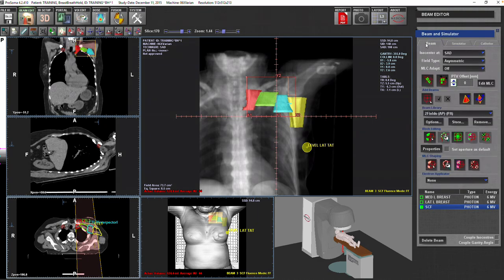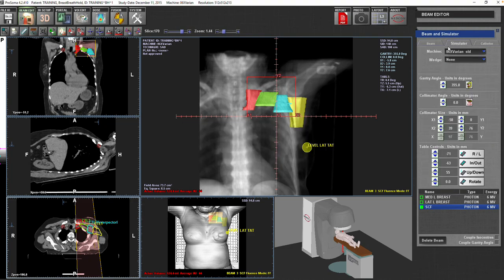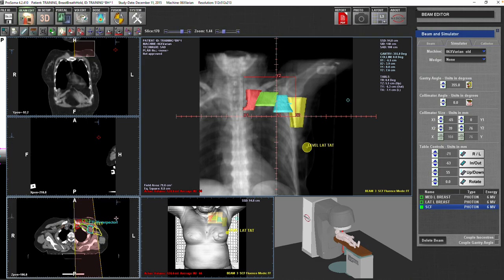Let's remove this block first, just to get rid of it, and then go to the simulation. So you can open X1 because you're still away from the spinal cord. You can see it here in the axial view.